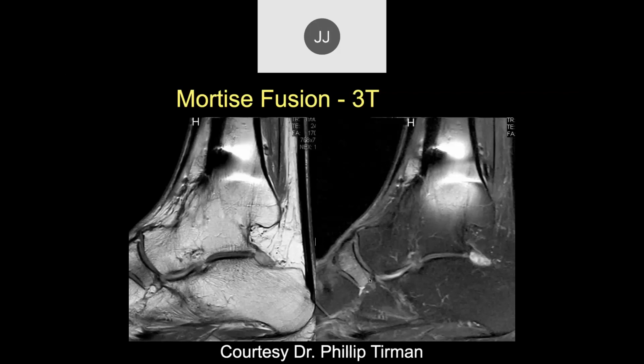The tibia is too far posterior and the foot is too far in, which is distally, probably increasing the stresses on the navicular here. And so this patient was symptomatic because of a trabecular stress injury of the navicular bone.